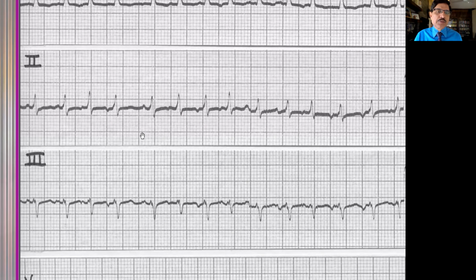So what will come? We will have an ectopic beat. This is an ectopic beat, a PAC, and this is a normal sinus beat. Then the ectopic beat triggers the supraventricular tachycardia, and it will be tachycardia because one impulse is directly coming and activating, and it is continuing. It doesn't have to come all the way from here anymore. Now it is being perpetuated here. Okay, that is why there is a supraventricular tachycardia.